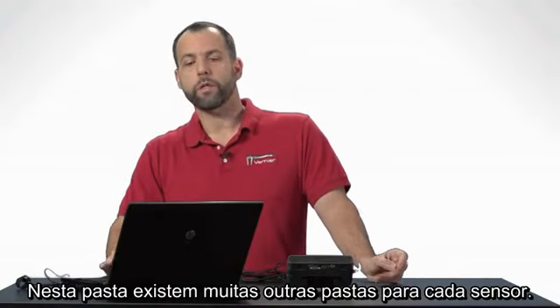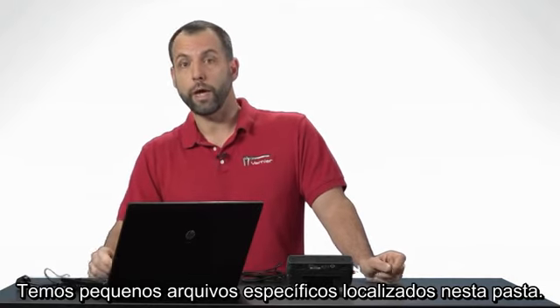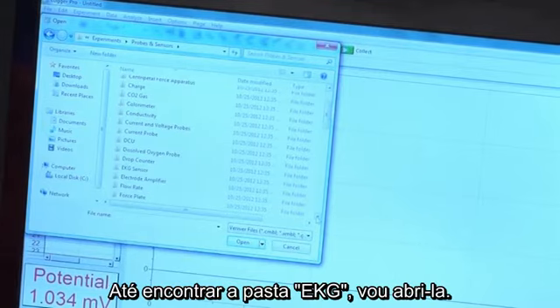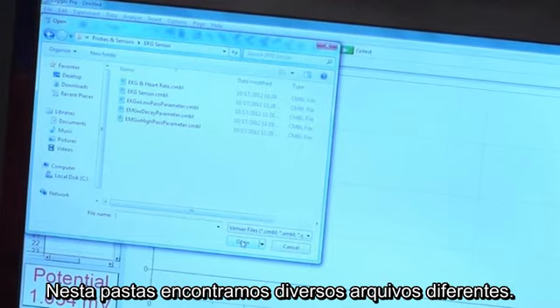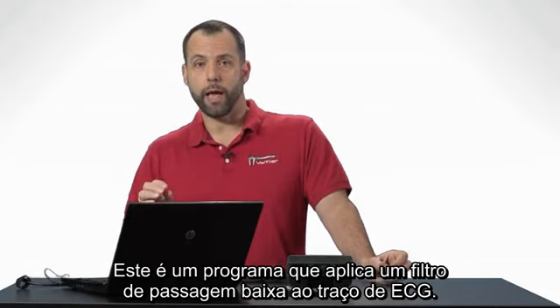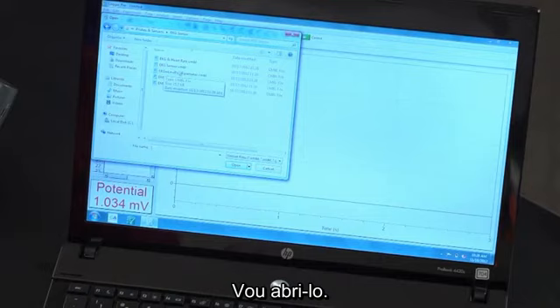Now, in this folder, there are a whole bunch of other folders for each sensor. We have special little files that are located in this folder. You want to go down and find the EKG folder. So I'm going to scroll down here and find, here's the EKG sensor folder, and I'm going to open that up. Now, what we have here in this folder are several different files, and the one that I'm going to open up is called EKG with low pass parameter. What that is, it's a special file that applies a low-pass filter to the EKG trace. So I'm just going to open that up.